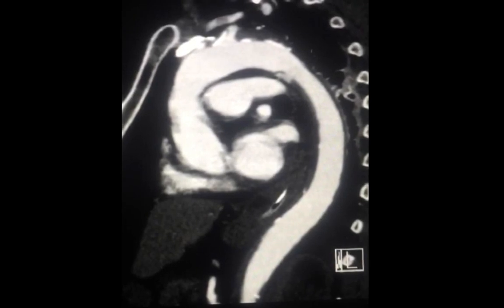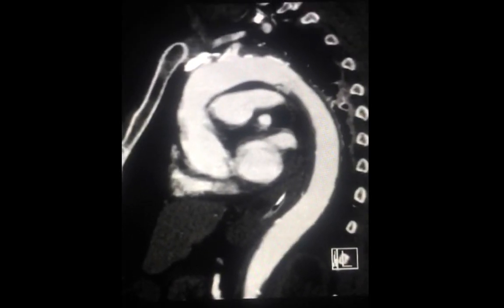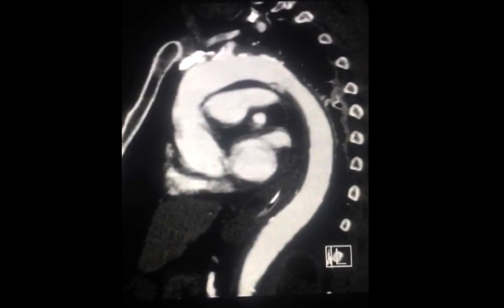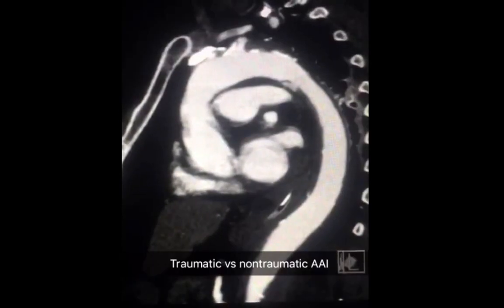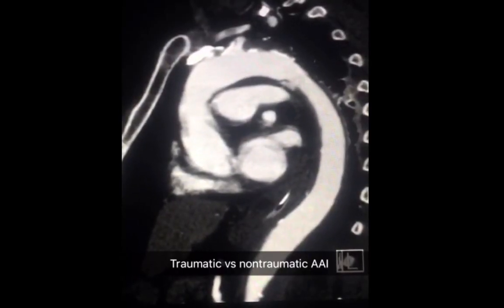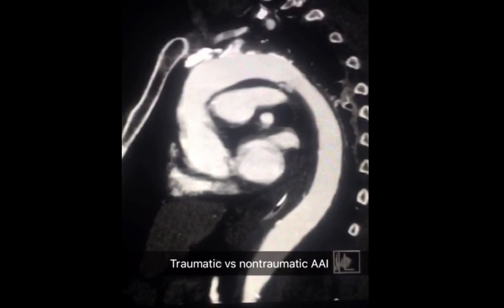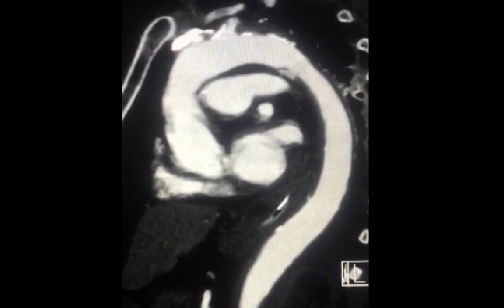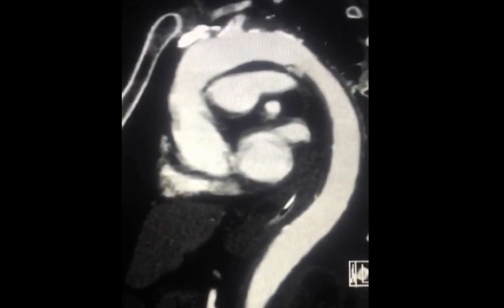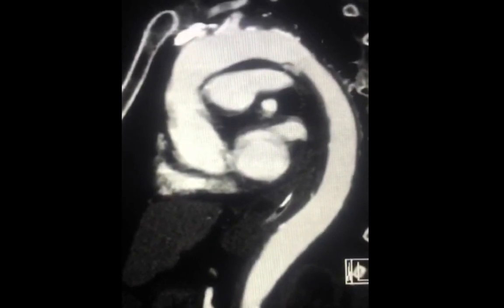I'm only showing one image today to convey a very important teaching point. One of the things you'd look for in a case of trauma is injury to the aorta. Generally speaking, acute aortic injuries are divided into those caused by trauma and those that are non-traumatic in nature. Non-traumatic acute aortic injuries unrelated to this case include aortic dissection, intramural hematoma, penetrating atherosclerotic ulcers, and bleeding aneurysms.